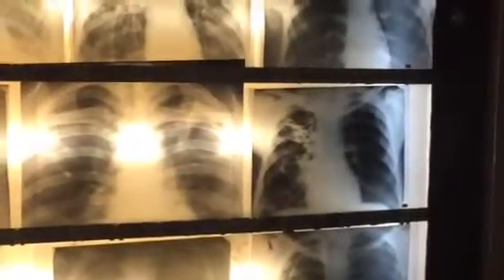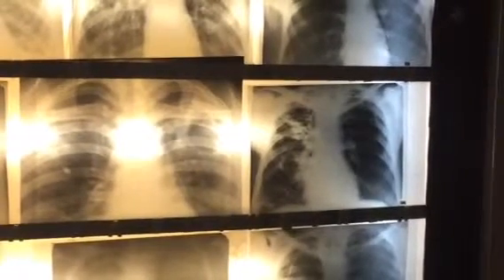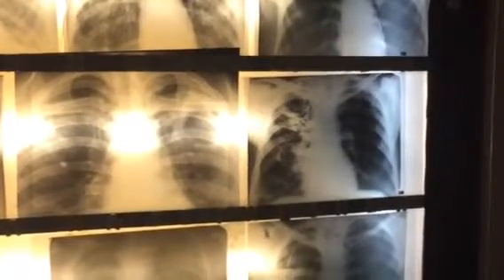Or endogenous reinfection. On this X-ray you see a cavern, yes, and fibrosis around the cavern. Fibrous cavernous TB. What is this? Petrification. Yes. It's a consequence after TB. So what's the difference between petrification and an old Ghon focus? A Ghon focus can be only one. Ghon focus formation only after primary tuberculosis complex. That's all.